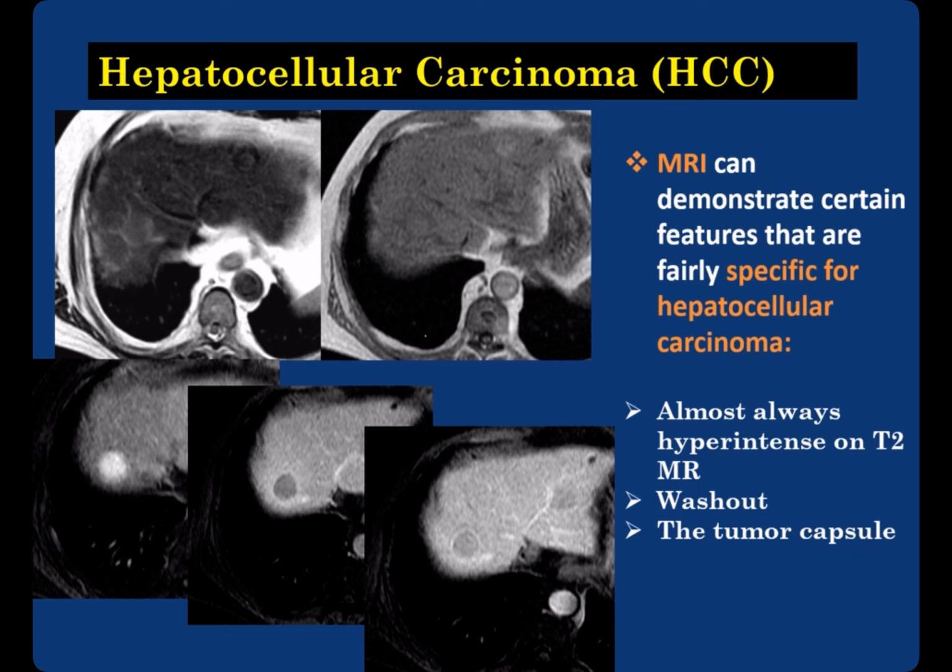They are hyperintense on T2 images, and the contrast enhancement. After contrast enhancement, we can see the wash-out phenomenon, and also we can see the tumor capsule in the delayed phase.